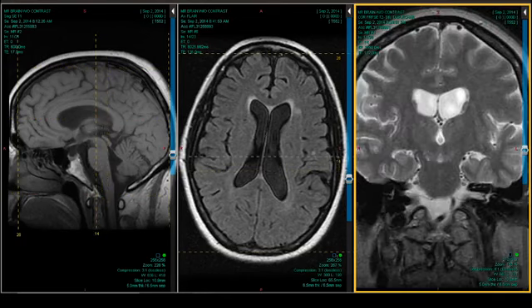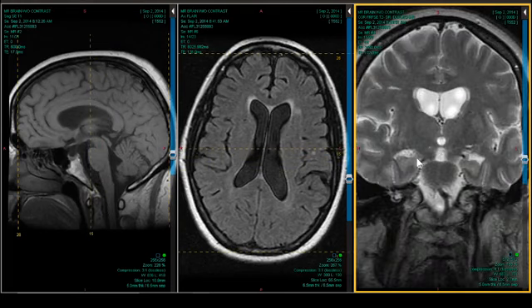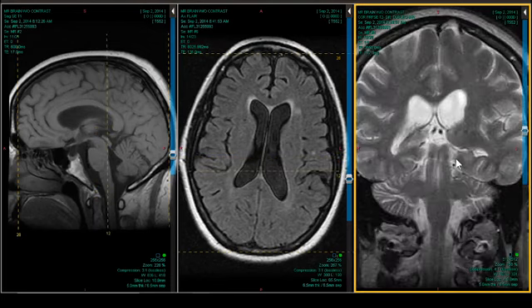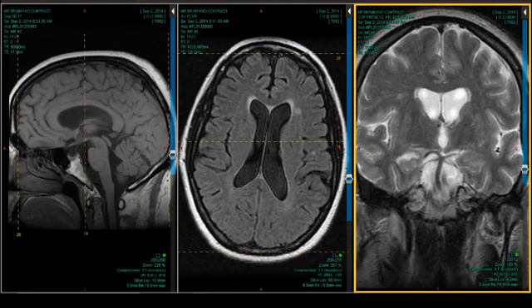Yeah. So the choroidal fissure is big. Temporal horn is a little big. And after looking at it further, the entorhinal cortex is a little flat on both sides. It's a little flatter on this side than the other side. I think you can see the asymmetry. So I changed my mind. Cerebellum not involved.